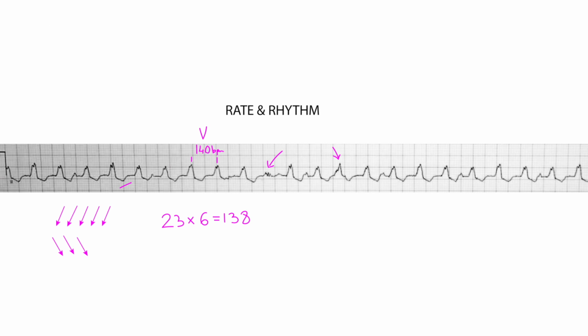Now, the next thing that's really catching my eye, what I'm looking for here is atrial activity, and I'm just not seeing it, but what I am seeing is this weird stuff, right?